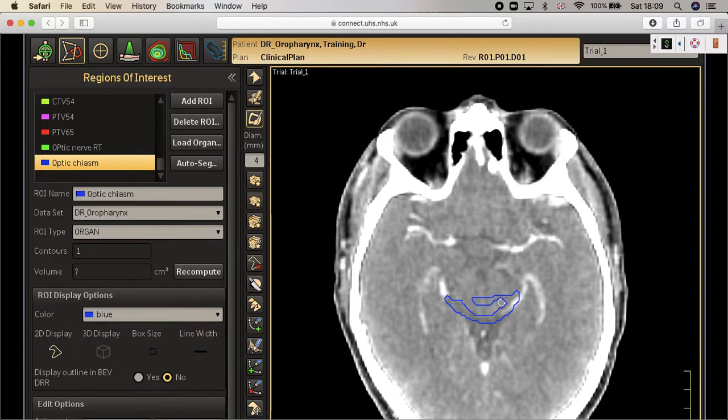I don't know if you will accept that. So this is a smiling face of the brain, and here is a mustache for the brain as well. I mean, it's just for fun, but you don't have to do that. So the mustache sign, or the mustache of the brain, we call it the middle cerebral artery.